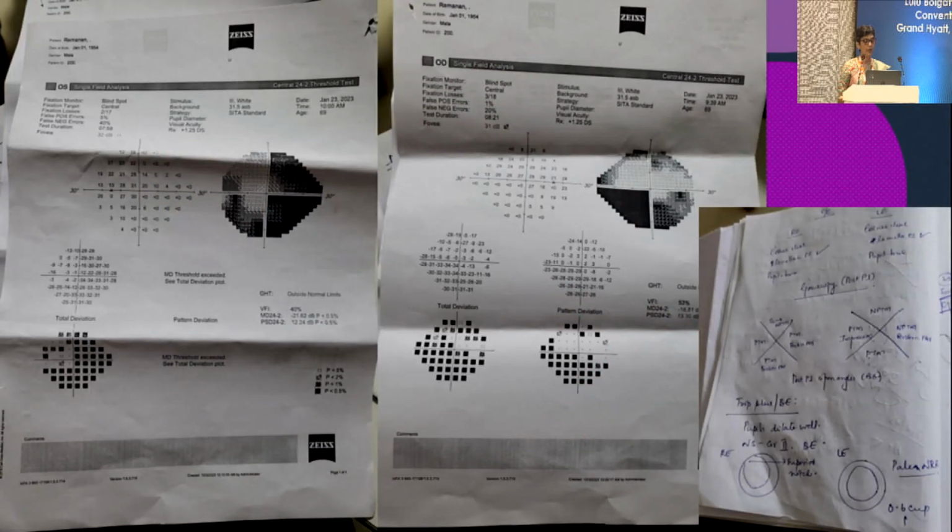This has been described. Now, there are certain conditions which can lead to the appearance of an advanced field defect, sort of a tubular field. This is a tubular field, and the patient showed a superior notch and a 0.6 cup with pale disc in both eyes. However, on repeated questioning, the patient said that he was hospitalized for nearly a month 35 years ago for life-threatening meningitis. So this infective condition has led to such tubular fields with advanced changes which appear like glaucoma.